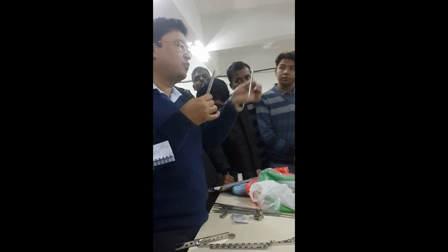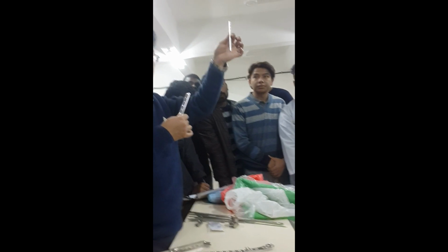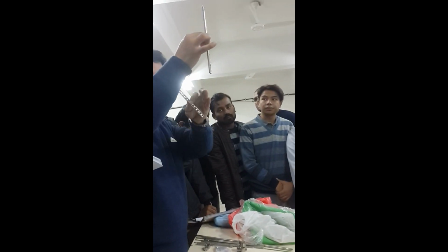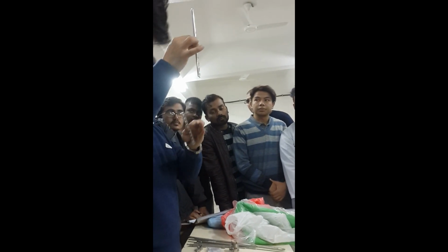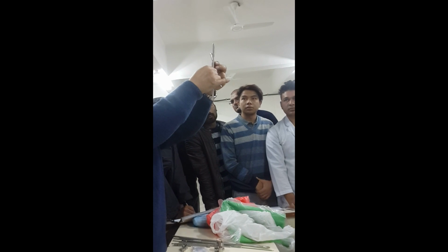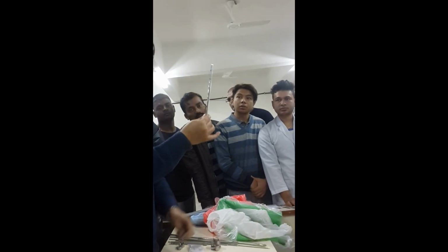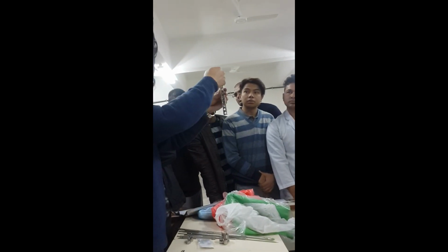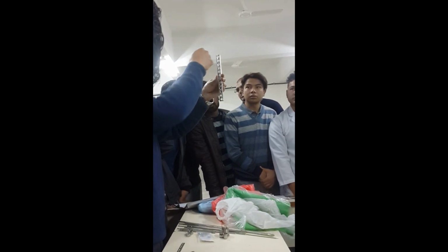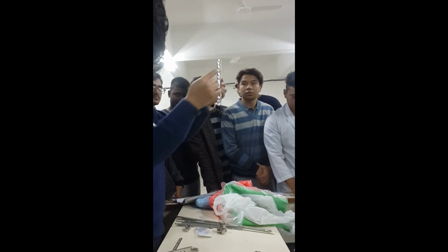And when we just talk among ourselves, we don't say 3.5 or 4.5. We say this is a small DCP, but it is a 3.5. And 4.5 is again divided into two: narrow and broad DCP. Narrow means all the holes are in one line. Broad means one hole is here, one hole is here, a staggered appearance.